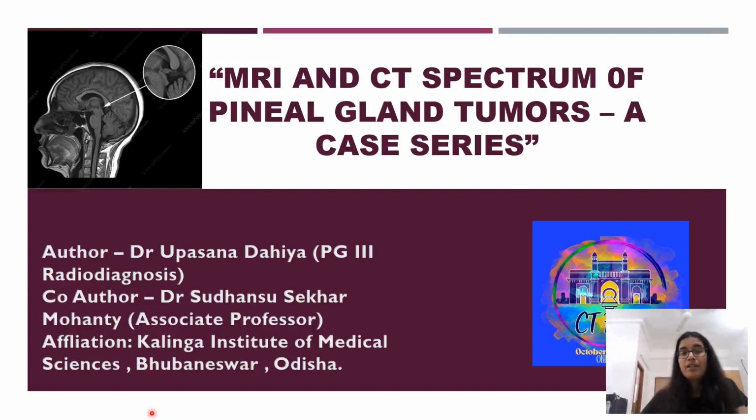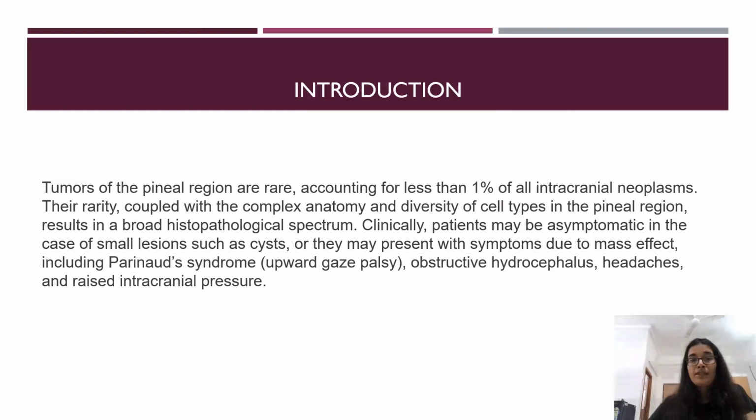My topic for CT Buzz is MRI and CT Spectrum of pineal gland tumors, a case series. So tumors of pineal region are rare, accounting for less than 1% of all intracranial neoplasm.